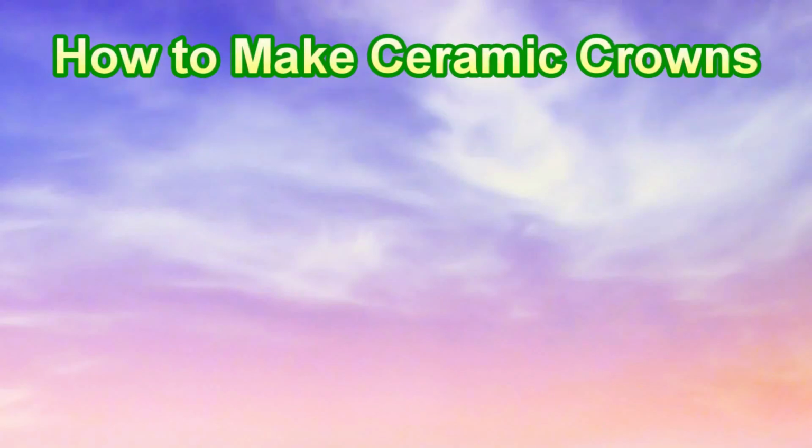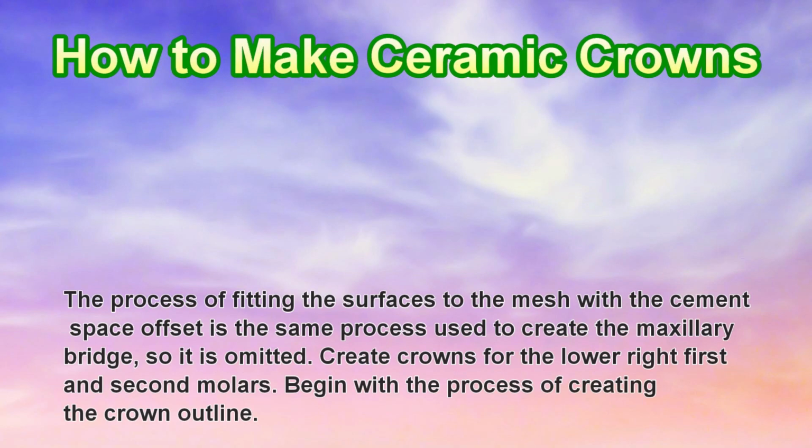How to make ceramic crowns. The process of fitting the surfaces to the mesh with the cement space offset is the same process used to create the maxillary bridge, so it is omitted.